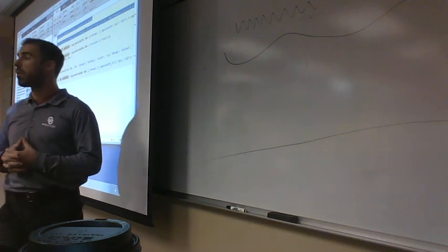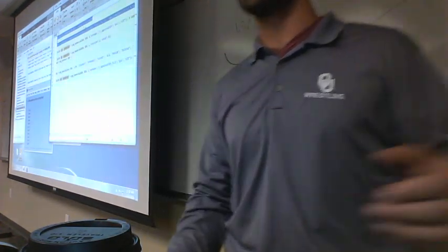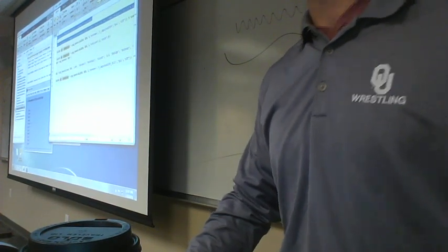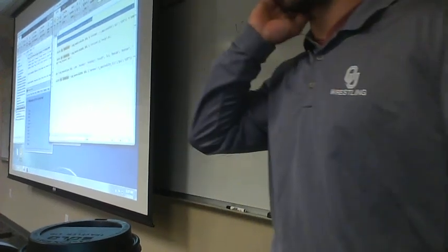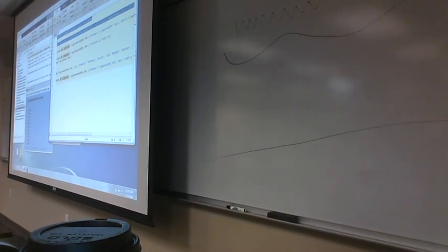Well, would run and advance do the same thing? I don't even know what run and advance does. This is like a new version of MATLAB that I'm not very used to. And it advances to the next section or something. To be honest, it could. I've just never run it. MATLAB is a beast in itself in a good way. It's awesome. It's like a whole matrix you can jump into and be a red pill or blue pill, whatever. There's a lot to know about it, and I know what I need to know in my little world. I just haven't bothered with the button. Probably just a slight difference.